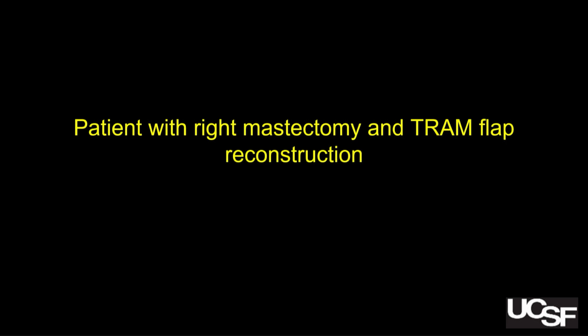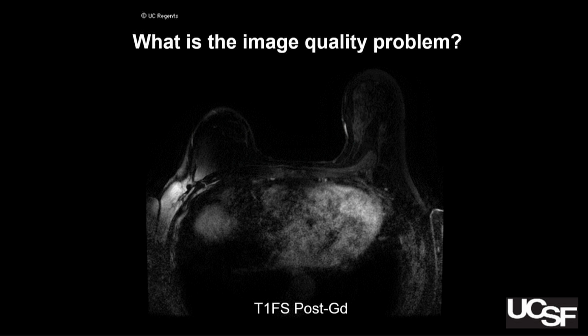Case 21, and that's because we actually went through 19 before. There was one more that's in the syllabus, and I have it at the end if we have time, but I'd rather get through the teaching points. So this patient has had a mastectomy and a TRAM flap, or a reconstructive flap. As you've learned, we don't really do these anymore, or at least the plastic surgeons don't, because the women like to have their abdominal muscles.